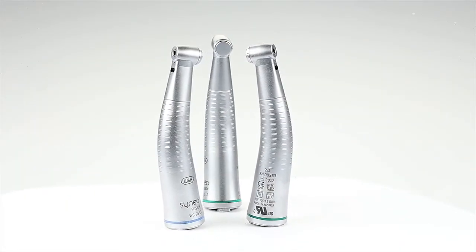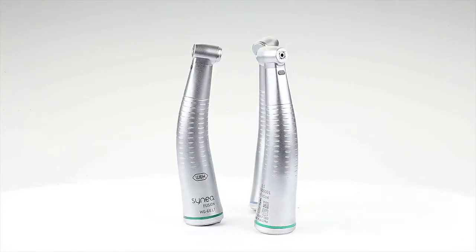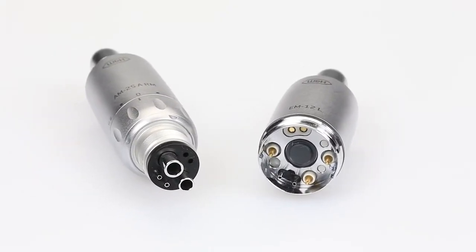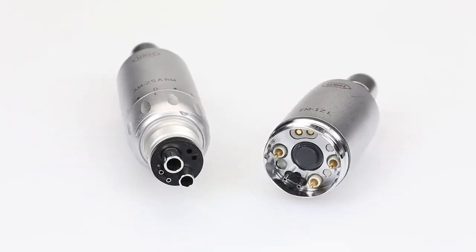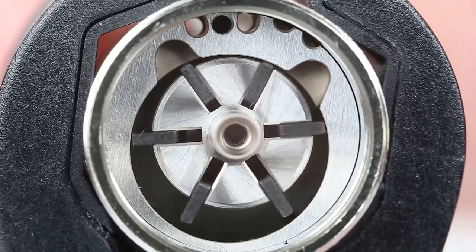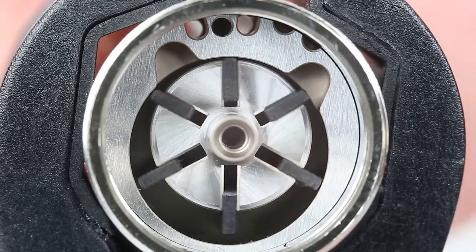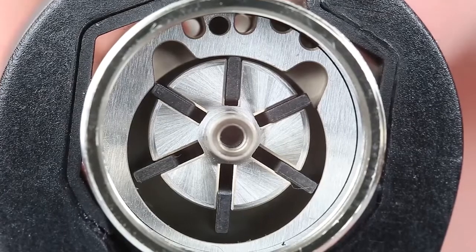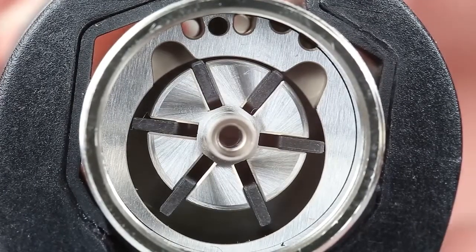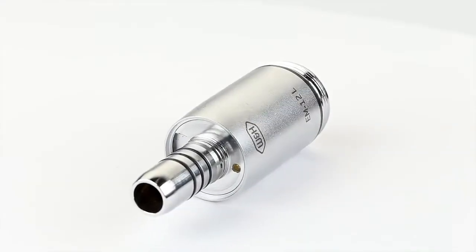For operating rotary instruments in lower speed ranges, green or blue straight and contra-angle handpieces are used, which can be powered with air or electric motors as desired. With air motors, like turbine handpieces, a rotor is made to move using compressed air, and this generates the required rotational movement. This technology is very simple, robust, and good value. However, the speed range is only roughly adjustable, with a range of only 5,000 to 25,000 rpm.